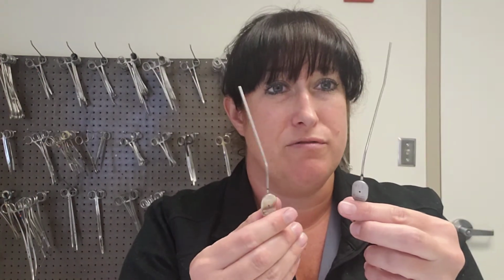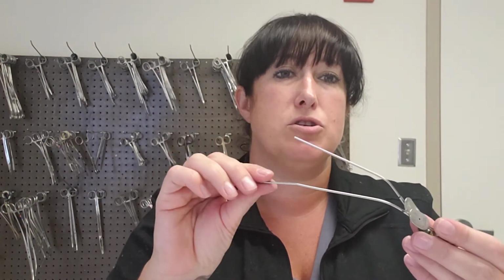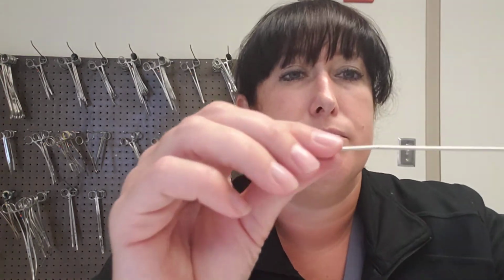I've got some relatively small ones here. These are actually 5s, but they look different, right? Like, one tip is shorter and one tip is longer. They're not supposed to be bent like this. Do you see that? This is what happens to instruments when you don't take care of them and you set heavy instruments on top of delicate instruments. It ruins them, and then I get them, which is fine.